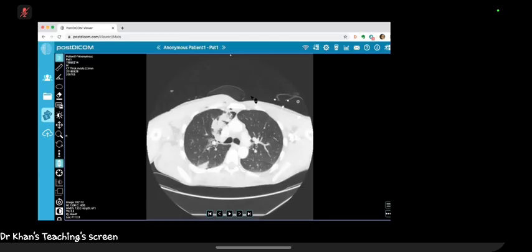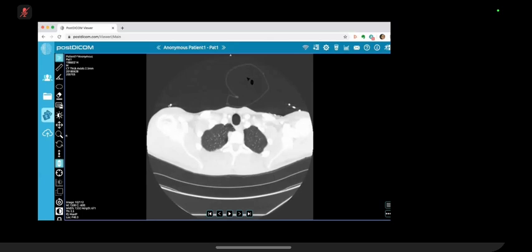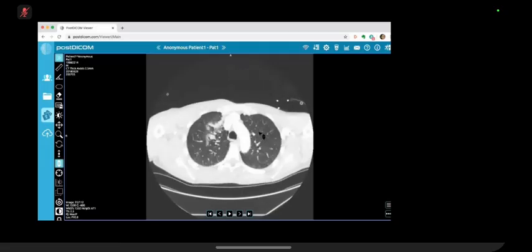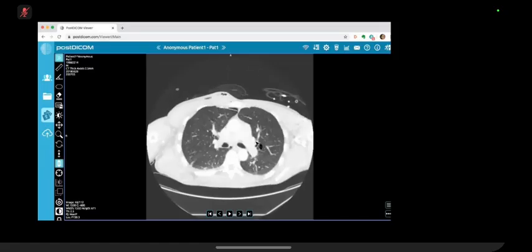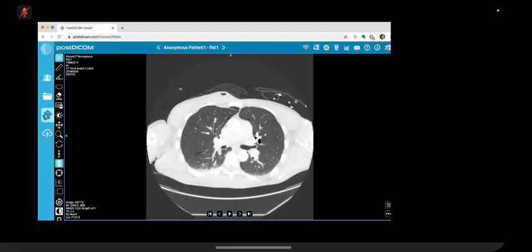But I think it's probably just a subpleural bleb or something. I don't see any obvious tracheal injury, but I can't exclude a bronchial injury in the mid section of the CT itself. However, this is a major injury, and I'll be suspicious of any injury to the hilar as well.